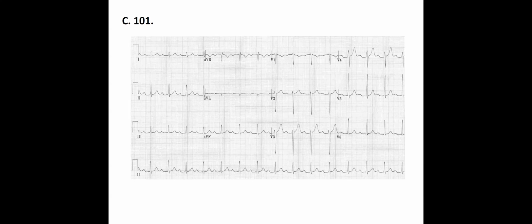Okay. So the first degree AV block, this is what you meant. Yes, that's it. Okay. Very good. All right.